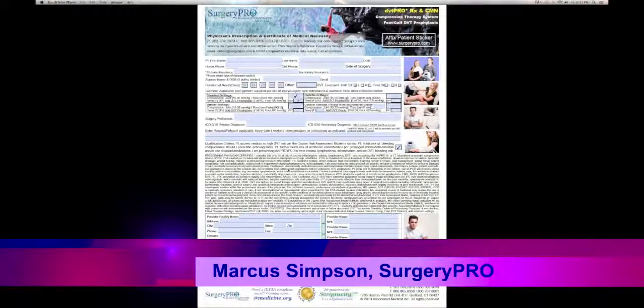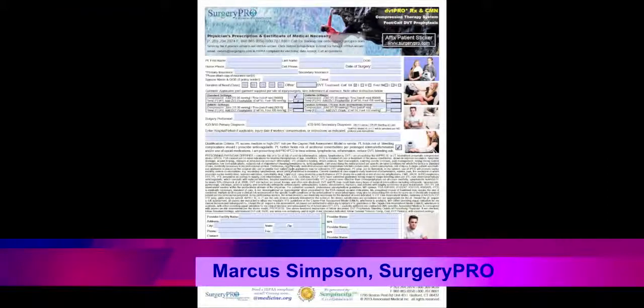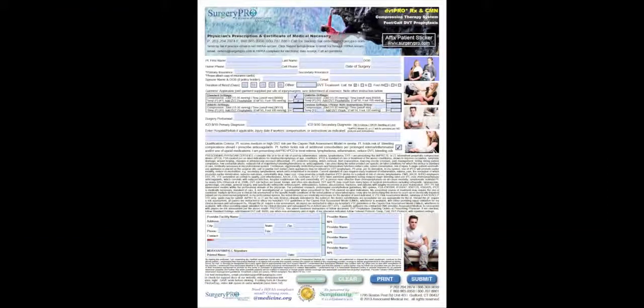Today I'm going to talk with you about the digital script workflow for the dvtPRO therapy system. And you should be looking at the dvtPRO script in front of you on your screen. You may actually have it open as well if you've clicked the instruction video button. And I want you to know a couple things when we start out.